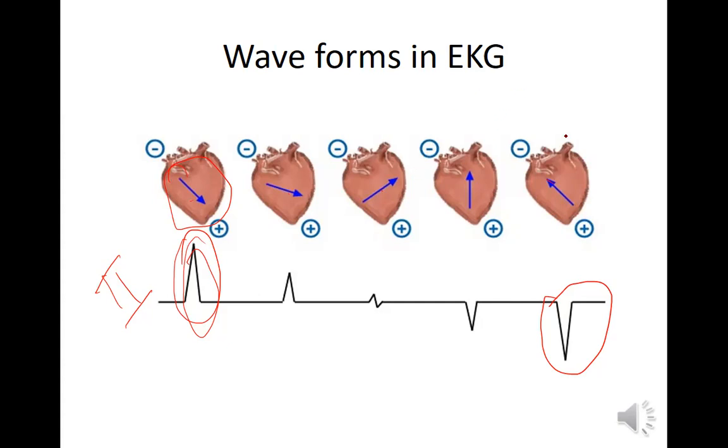I don't want to confuse you, but you see this mean QRS vector? What do you expect AVR to look like? I mentioned this before too. Well, AVR is supposed to be negative on a normal, and this one it would be negative. Like AVR here would be negative. It would look like this. But over here, it might be positive. It will be positive, right? Because we're looking at lead 2, but AVR is the complete opposite. Positive electrode is on the right arm. Right. So this would be positive.